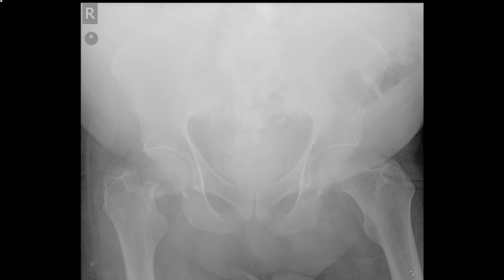On the right, over here, the neck, as we've previously looked at, is not continuous. There are odd, dense lines across the femoral neck. The left side, you can see the trabecular pattern. There is a continuous neck, and this looked normal, although the leg itself is rather abducted. So going back to the right side, you can't see the trabecular patterns nicely. There's some lucency here that shouldn't be here. There's an abnormal sclerotic area underneath the inferior margin of the femoral neck.